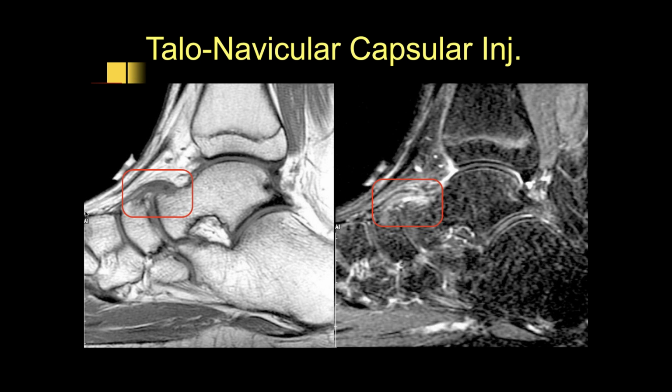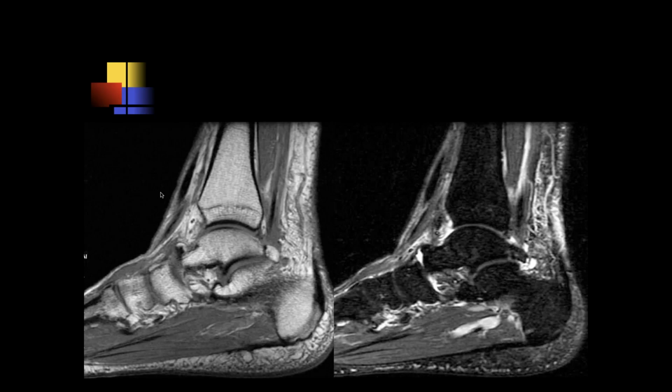Yeah, so this is a very common source of injury. You've seen many of these already in the fellowship. It's that dorsal talonavicular ligament. It often gets thickened. It's also an area where you can get large osteophyte formations, as we've seen in the past. But that's another common area where you can get kind of overuse injury. And the mechanism is kind of debated. Some of it may occur in sleep where you hyperflex the foot and produce chronic strain on that dorsal talonavicular ligament and capsule, causing an injury, and then it can become thickened over time. But it's a common location for degenerative disease.